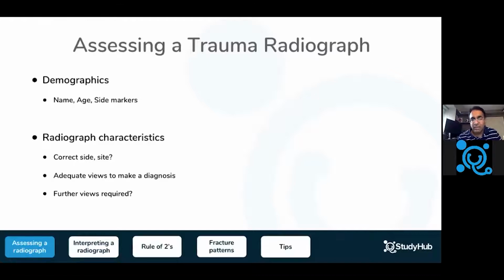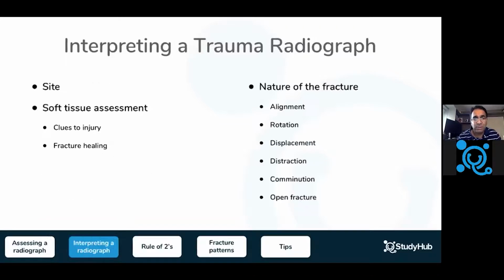As with anything, you develop a systematic approach to approaching a radiograph, and the most important thing from your point of view, especially when you're learning, is to stick to it religiously, no matter what you're doing. Whether it is a chest x-ray, abdominal, or a plain film of a musculoskeletal radiograph, stick to the same steps that you would do day in and day out.